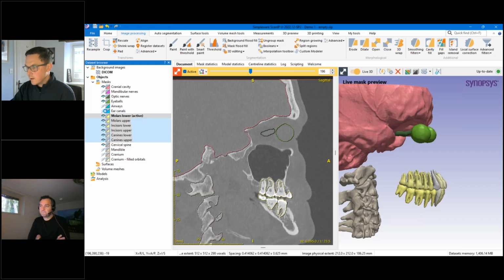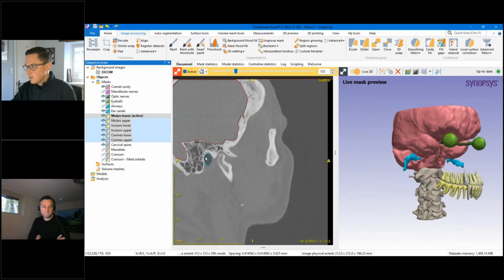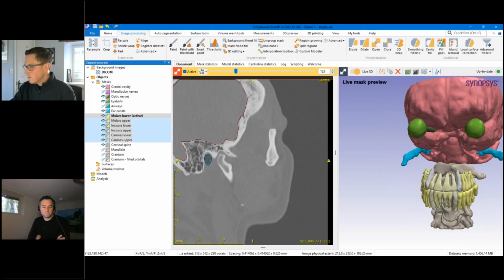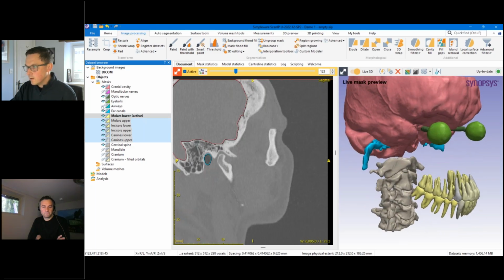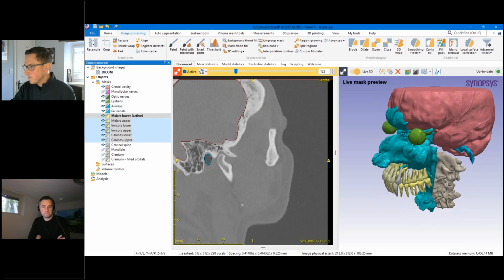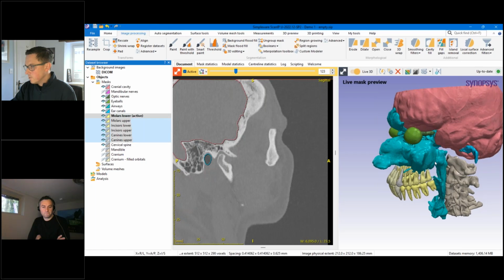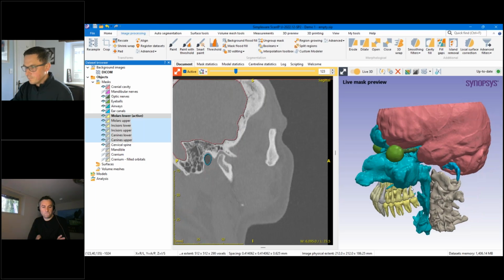The last two: ear canals, again just isolating those from the CT. You can see that blue mask there, maybe more looking at the ear region. And then finally, the airways. You can get all the airways separated out of the nasal region and mouth if it's present, for example. That's all there separated out as well. And again, it's all disconnected intelligently, so you're not having to disconnect it from the air around the subject.